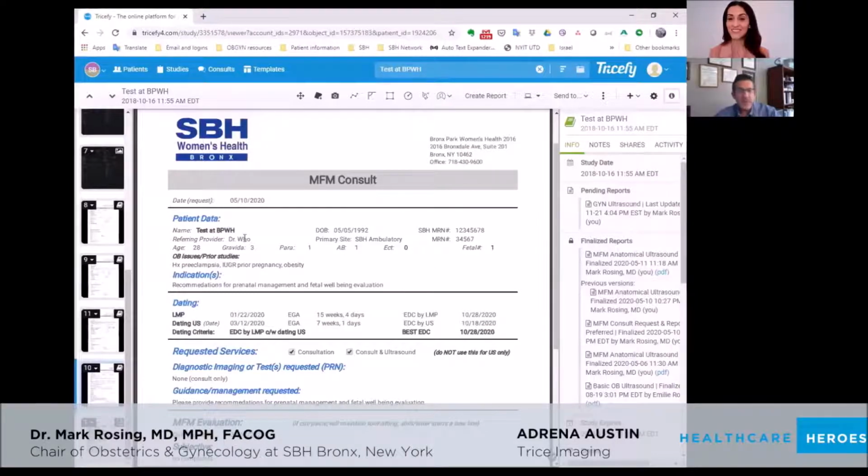Another interesting thing about the fields that you create is that some of them will pull information, and you can choose what type of field it is, whether it's a text field or a numerical field. You can create drop-down menus. You can create what they call snips, where you can either pull something from a database or a list of items, or choose your own and modify that all together.